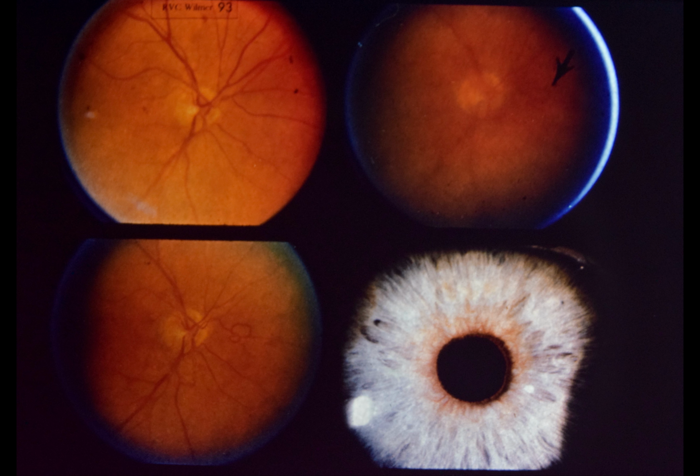proliferative retinopathy as well. This 57-year-old white female has had diabetes for many years and has been followed by us since 1970. Upper left is a 1971 photograph of the right disc showing scattered hemorrhages and no proliferative retinopathy.